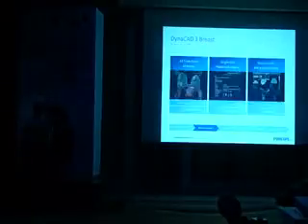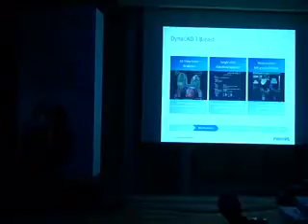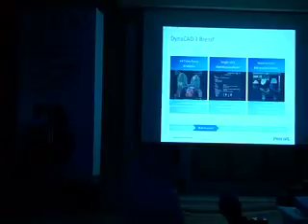and the main important usage of this tool, which is a software, is to have the dynamic curves in a proper way and in a fast way. And of course we can see all the images, the diffusion, the perfusion, and all other kinds of images of the MRI breast. And there is a very nice and easy tool to help us to have the guided biopsy.